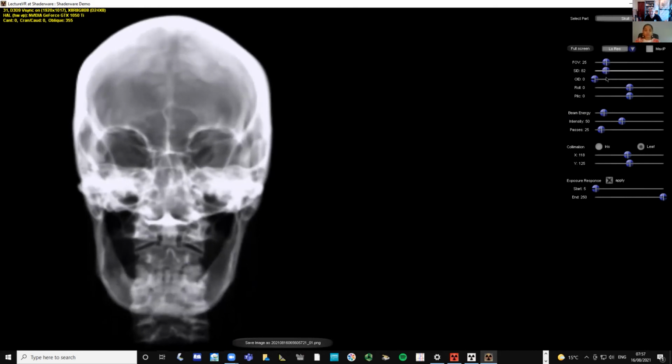Yep. So this is a really great tool. Normally we would resort to drawing triangles on the whiteboard, wouldn't we, to try and explain this? But here we can actually see it happening in real life.